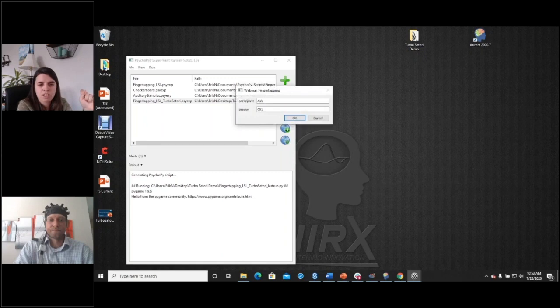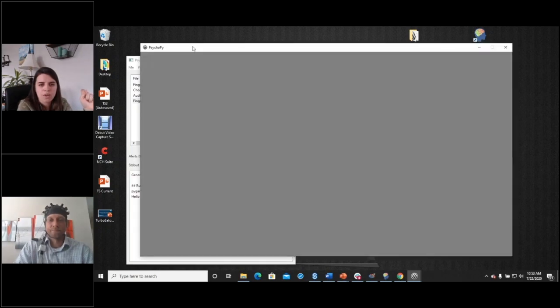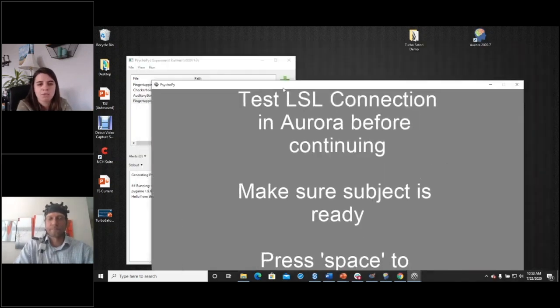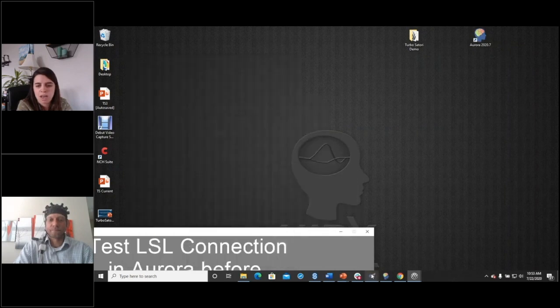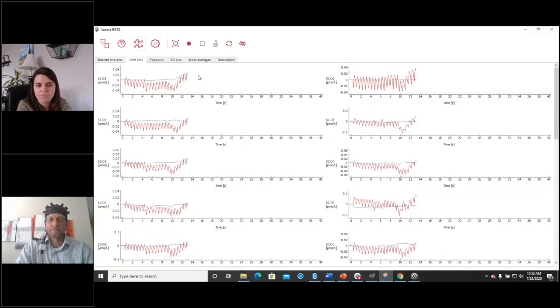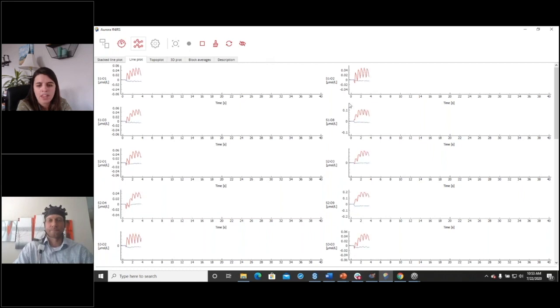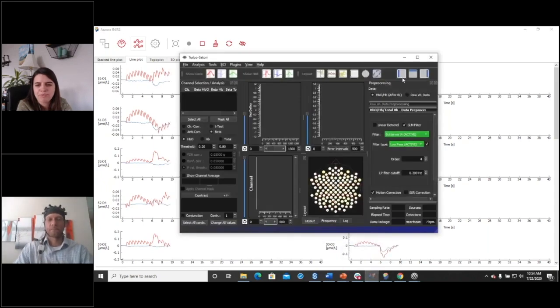So I'm just getting this started. Okay, and we're going to see a prompt that the LSL stream is open and it's time to start recording in Aurora. So I'm going to minimize this and come back to Aurora, and I'm going to start to record now. Okay. And now we can open up the stream in Satori.